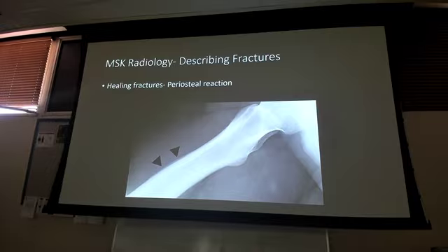So there's your periosteal reaction. Remember we looked at that for those like hairline fractures. You can look at mom and dad and say, yep, they had a fracture, it's healing. Just know that we can see periosteal reactions on x-ray. My cortex ends, right? I got my cortical bone here, and then I have this extra little radio-opaque line. Looks like a little hill just sitting right on top of the cortex. That's a periosteal reaction. Sometimes they're bigger, sometimes they're smaller.